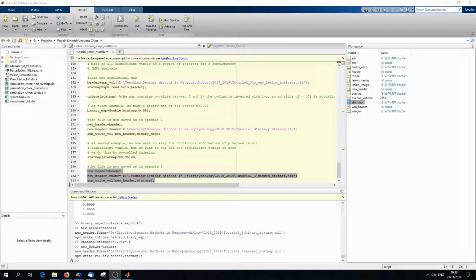There are questions like, what is wrong with my header? So in the future, if you ever have problems because a function tells you something's wrong with the header, you can just open the header with these functions and look at the header yourself. Or some people want to get some regions taken out of atlases, as I've done, right now. They want to produce some region of interest. This is a problem that is often encountered, and the standard functions might produce some errors.